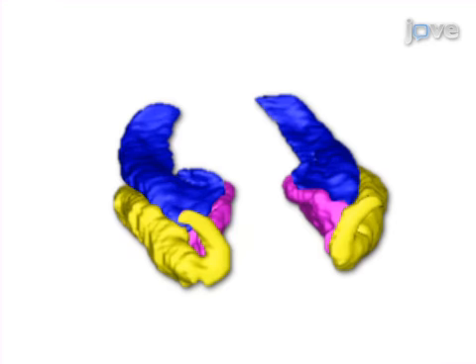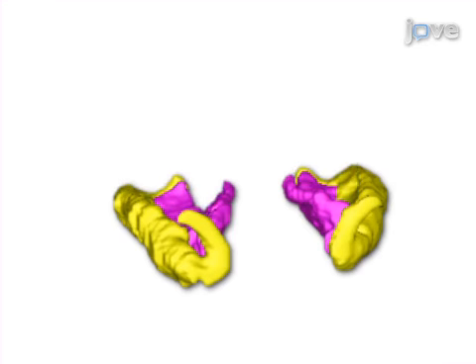The second step is to locate the longitudinal extent and the general borders of the hippocampus, and then trace it slice by slice in the anterior-posterior direction. Next, trace the anterior structures of the parahippocampal gyrus, namely the entorhinal and perirhinal cortices, in parallel, to better accommodate variations in their mutual borders.